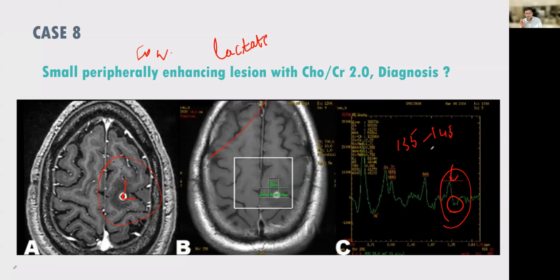In conventional imaging, a T1 hyperintense ring with a central T2 hypointensity, I believe these two signs are very, very specific for tuberculoma. T1 hyperintense ring, T2 central hypointensity. T2 central hypointensity is often a very neglected thing in tuberculomas. You do not get T2 hypointense signal in NCC. You get it in tuberculomas. And one more interesting practical thing which I have seen is that scolexes get suppressed in FLAIR. Normally, none of the tuberculomas get suppressed on FLAIR, I have seen.